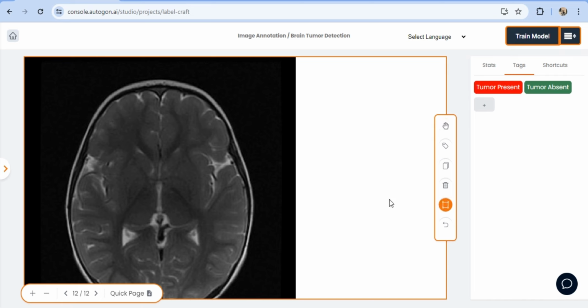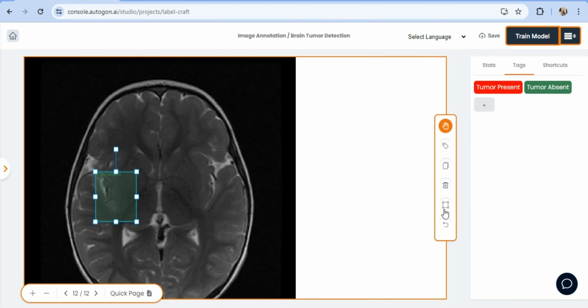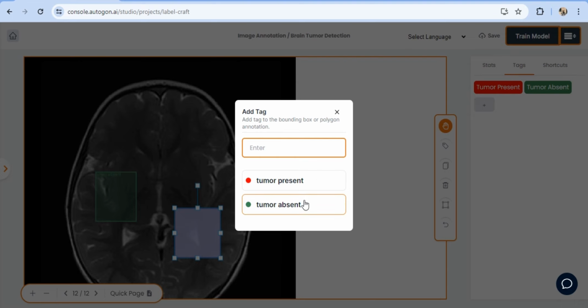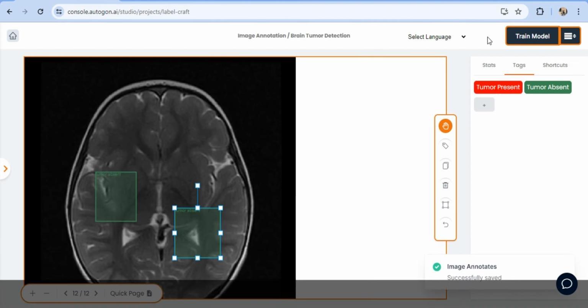All right. Yes, there's an absence of tumor on this scan, so I have the flexibility of picking across a lot of regions, and I like this, of course, just to give my model enough information and enough insights to work with.